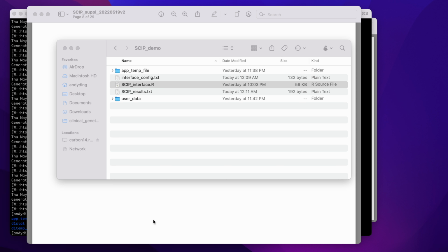That just completes interpretation. I'm going to stop this video here. We have completed setting up and running the front-end visualization interface for a sample. This video and the previous video covering the backend cover everything you need to know from scratch, setting up SCIP, and eventually visualizing CNVs detected in clinical samples.